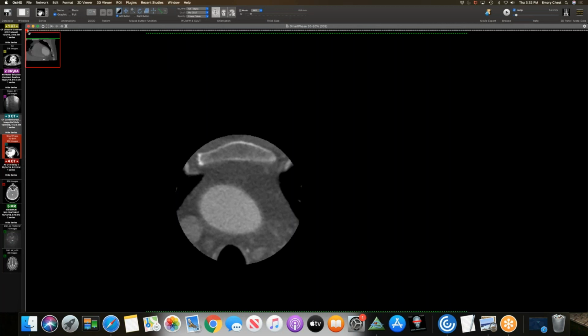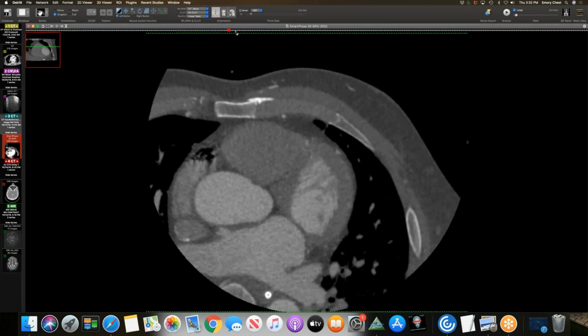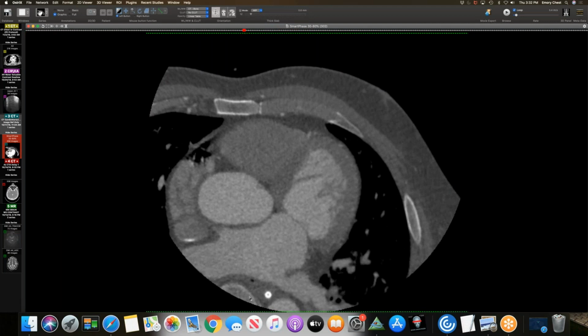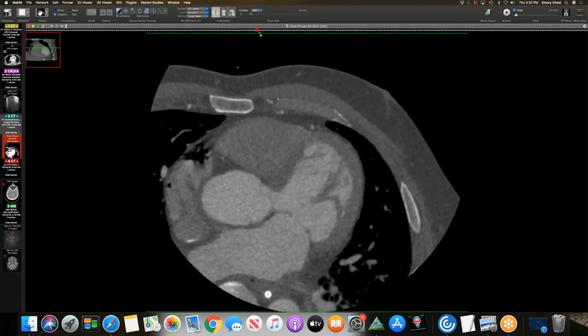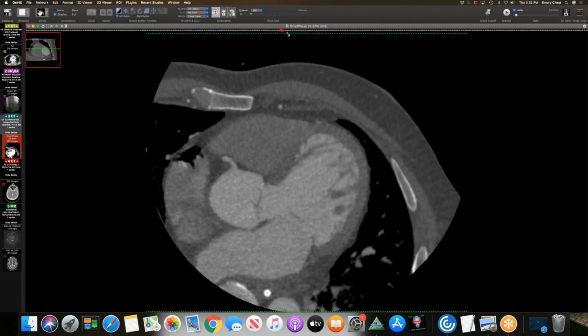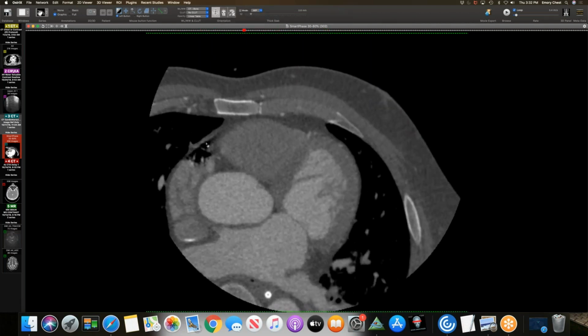Because these always develop along the pulmonary venous ostia, wherever they ablate. But it's interesting because it looked like you were showing the patch was on the right-sided pulmonary vein. Yeah, it seemed like it was right on the right inferior pulmonary vein, but this is where the gas is there. Well, that gas could just be between the esophagus, in the pericardial space, just like you see stuff anteriorly there. I don't think all of that is in the atrial appendage, do you? Or maybe it is. No, it is in the atrial appendage.